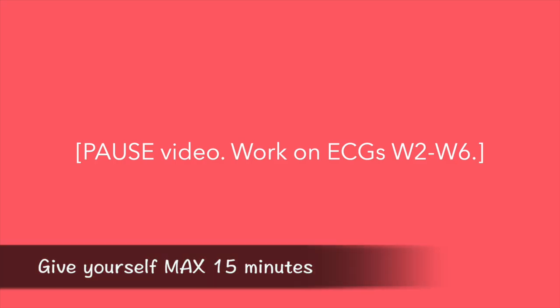Alright, now it's your turn. Please work on ECGs W2 to W6. And once you're ready, resume the video and I'll review the answers with you. Enjoy!